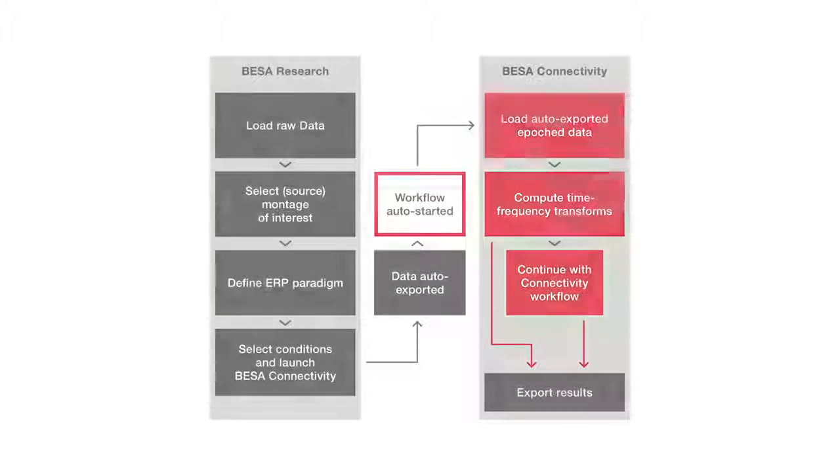In this video, I would like to walk you through the steps that you need to take if you want to analyze your data in terms of brain connectivity between the generators of oscillatory activity. This diagram shows the steps that you need to take.